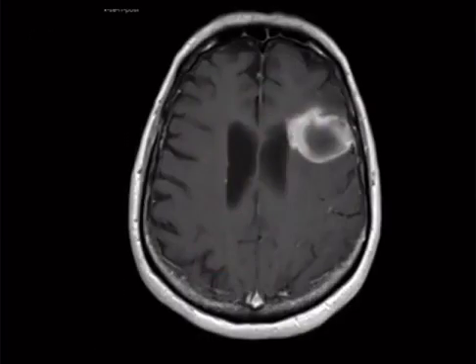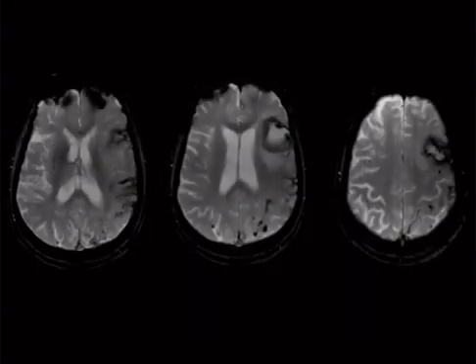All right, next case. So this is a T1 post-contrast image. How did I know it was T1? The CSF is dark. How do I know it's not FLAIR? White matter is white on T1. Okay, so following it up with this, all right, gamesmanship time.